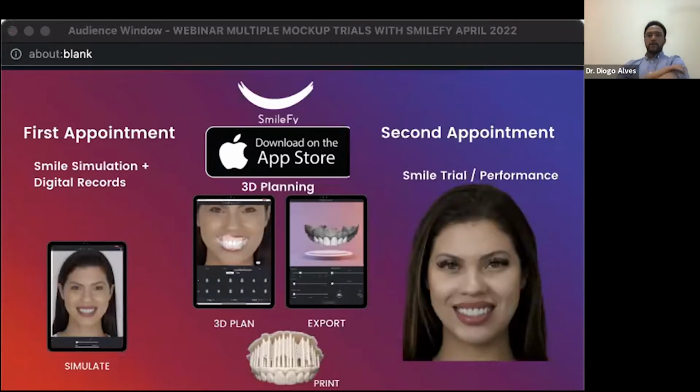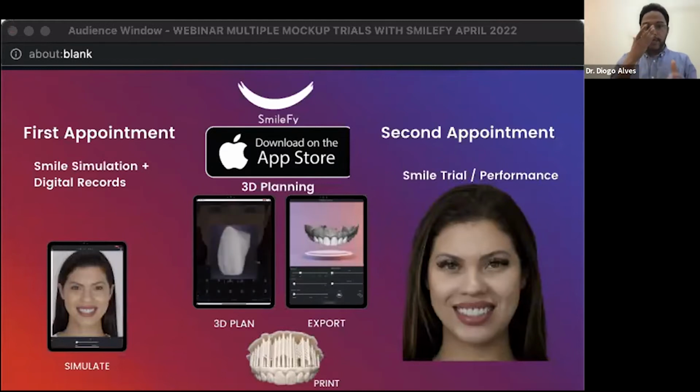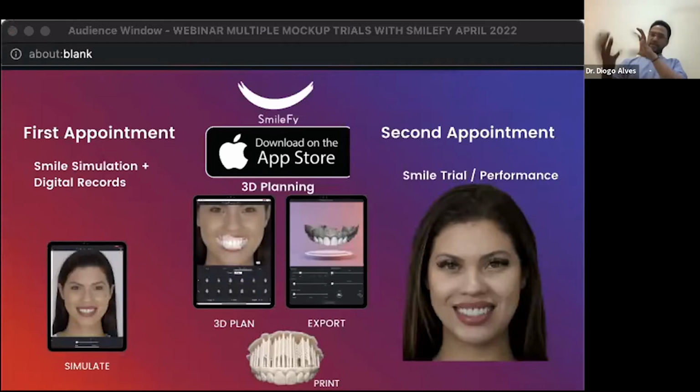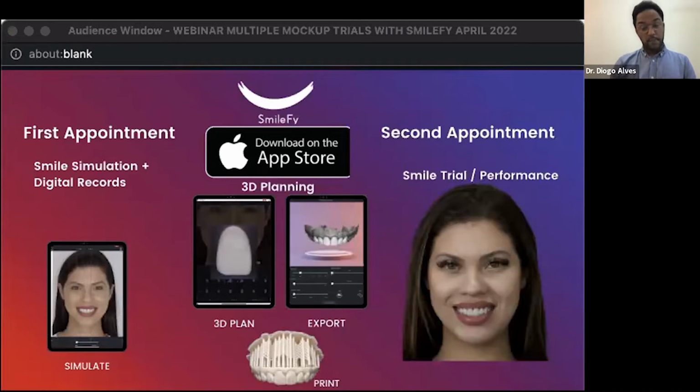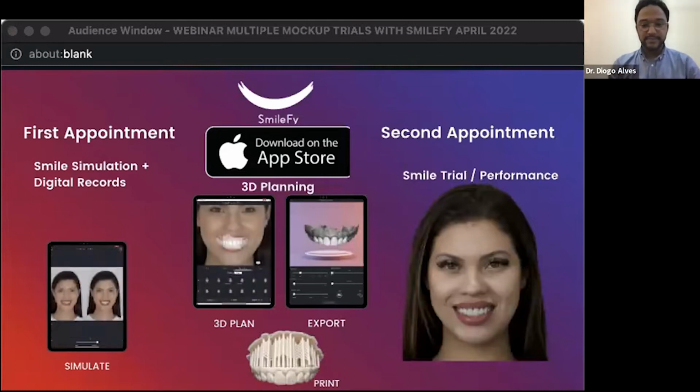So we're going to go over a workflow that goes from a first appointment and what you need to do in that first appointment to then do this intersection appointment. Let's say like that. It's when you 3D plan multiple mock-ups to 3D print, to then call your patient on a second visit to perform the smile trials. And if you have time, to initiate the treatment from that second visit on.